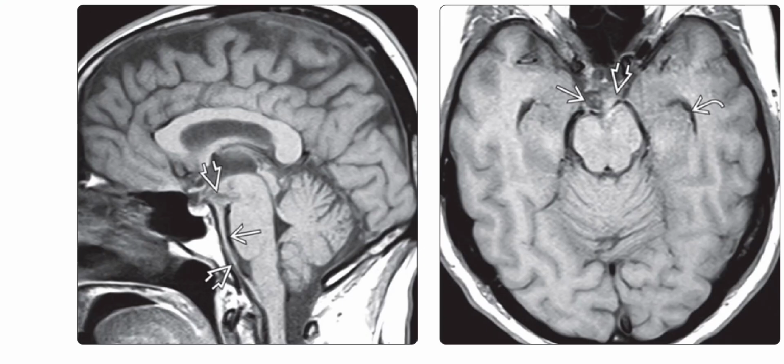So left is the sagittal T1 weighted MRI sequence, and it shows the typical findings of acute aneurysmal subarachnoid hemorrhage. Note the dirty CSF that appears iso-intense with the adjacent brain. The normal basilar artery flow void is surrounded by the subarachnoid hemorrhage.